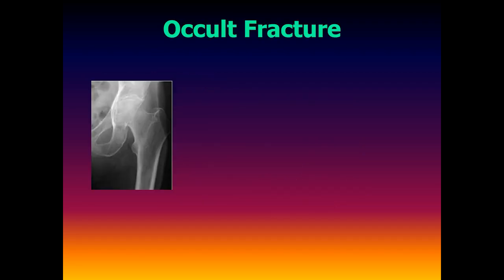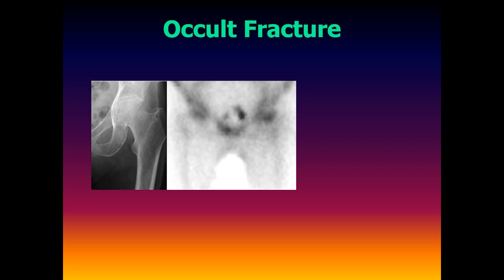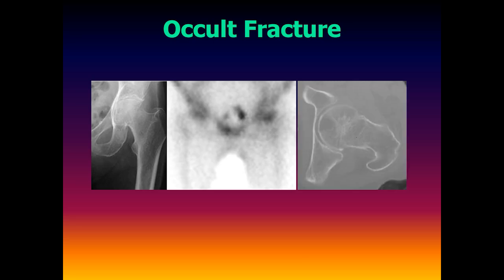This patient had an occult fracture of the left femoral neck. The radiograph is negative. The bone scan is positive, and the fracture is subsequently identified on a CT scan.